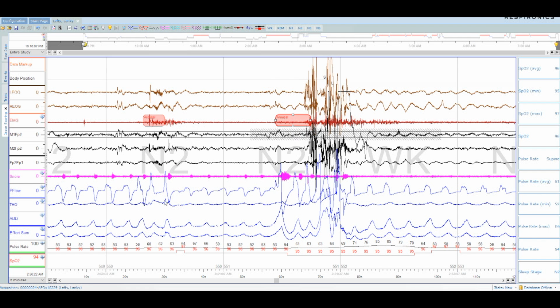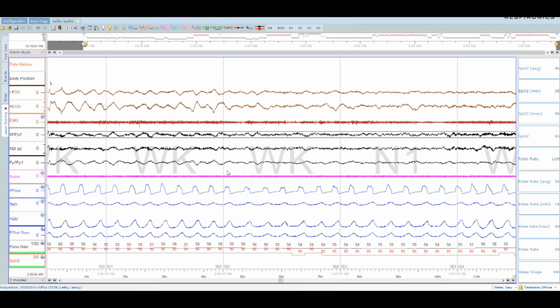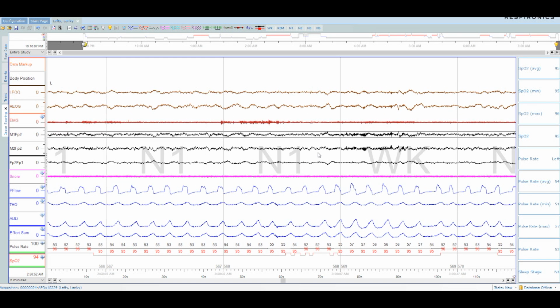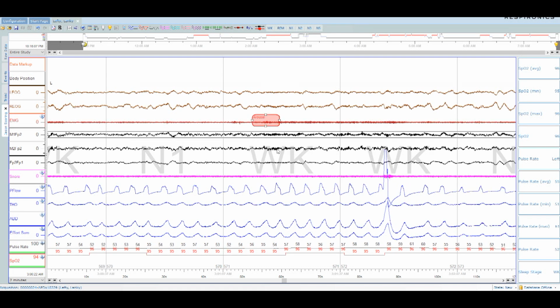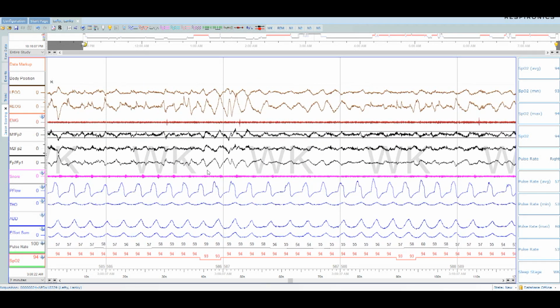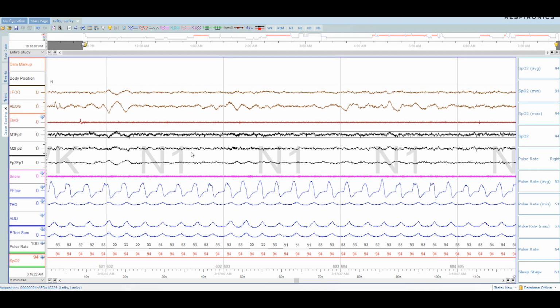It's not enough to get a baseline of breathing right there. We have the arousal over here, and a long period of wake, it looks like up till here. This is that little in and out of sleep thing we saw when we were staging. Kind of that in and out of sleep, like a sleep transition. Oh man, I really definitely think I know what night this was. I remember doing this.